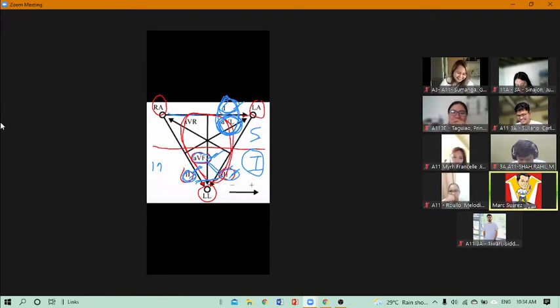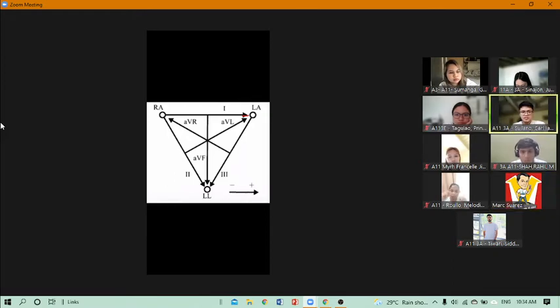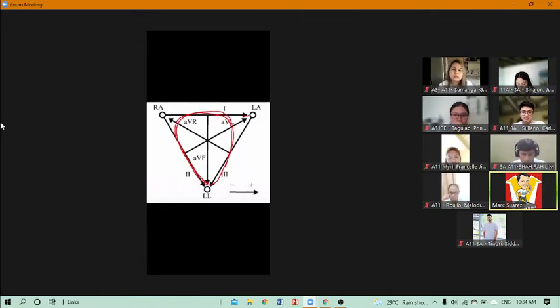So when you are given an ECG, please always go back to this drawing. This illustration is very important. That is all I have to say about this one. Okay, so let's proceed. What are we missing? aVR, Doc. aVR. Okay, for now let's set aVR to the side. Aside from aVR, what are we missing?